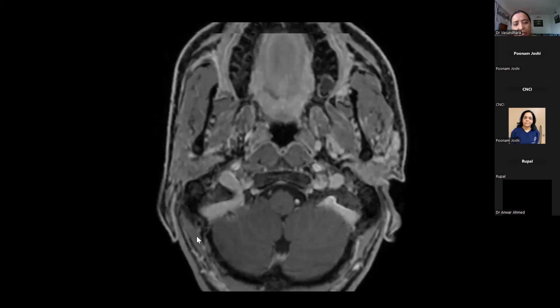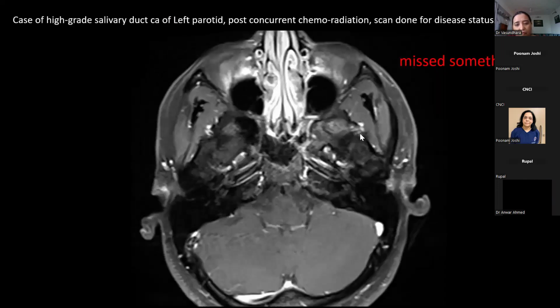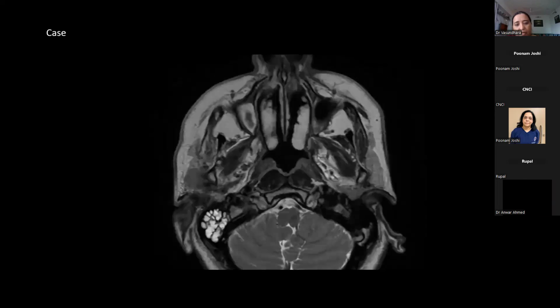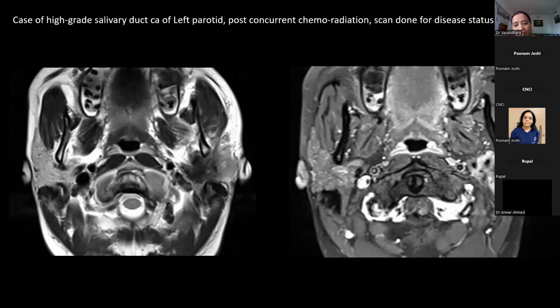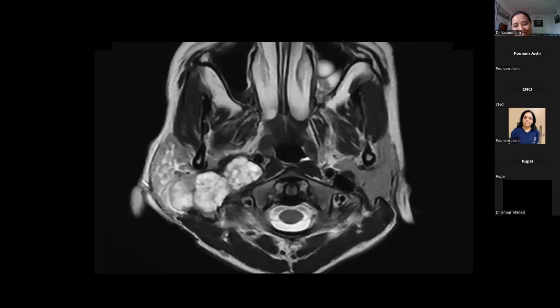Parapharyngeal with a carotid relation. Okay. This is not something which is written in books, but this is what I have observed. I have to do a study to validate this.